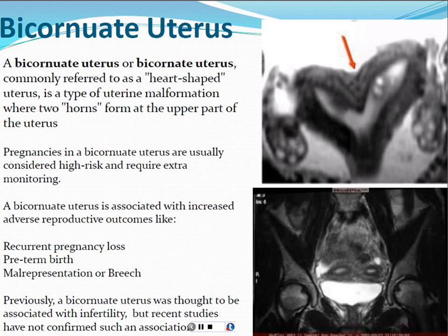There's another similar looking structural anomaly, which will still have a flat top across like a normal uterus, but will have this division coming down through the center of it. And that's not to be mistaken for this heart-shaped one. That one's called a septate uterus. So it's normal shape overall. It just has this septum going down the middle. And it's important for us to recognize that as well, because the septum may come down very low or partially. Depending on how low it comes and whether it's interfering with fertility, they can resect that septum surgically.